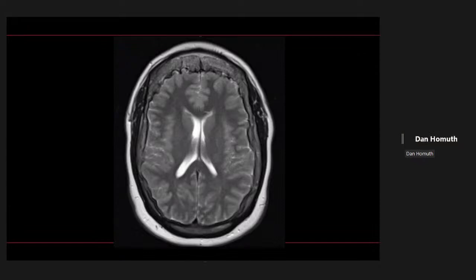Is it in the sense that there's diffuse volume loss during development, then the cortex can end up thickening given that potential space? Yeah, so you can see that in the setting of some asymmetric atrophy syndromes. What is the Dyke-Davidoff-Masson? It's usually a pediatric insult to a single hemisphere that can cause compensatory hypertrophy or thickening of one side of the skull.